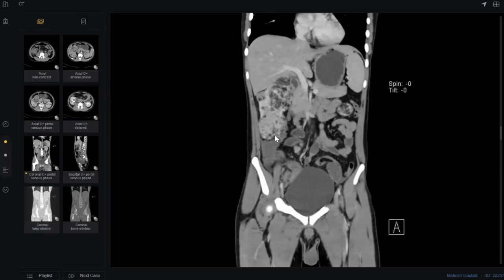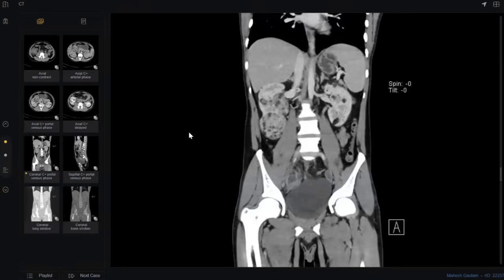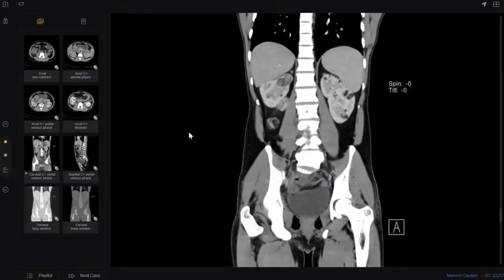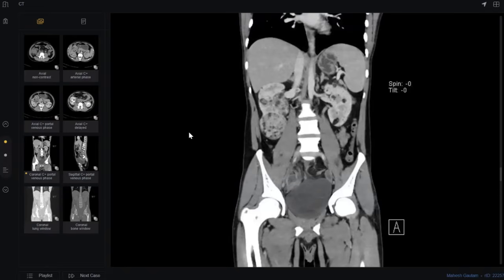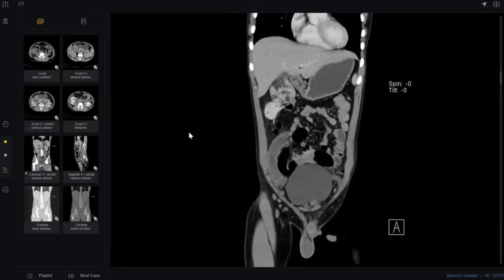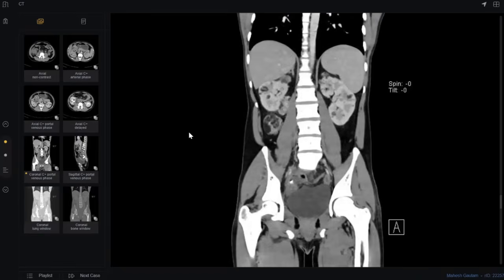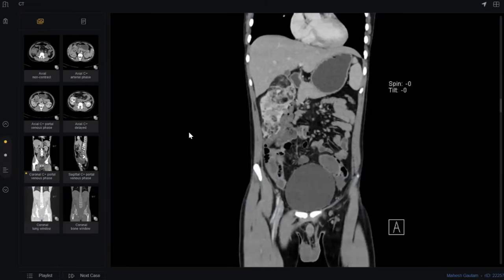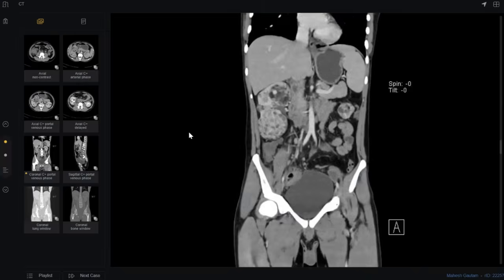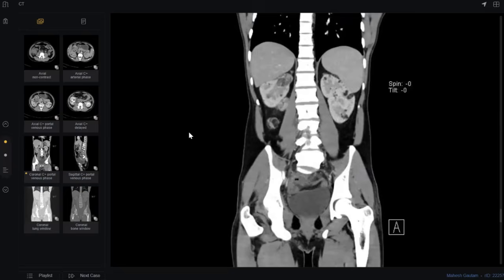What do you think? I think that yeah, there is some herniation. Is it easier for you to detect the connection or the anatomy of the appendix on axial or coronal? I think, actually, in my routine I use both coronal and axial images. So what's your final diagnosis?